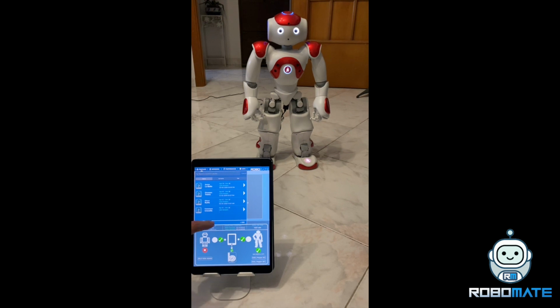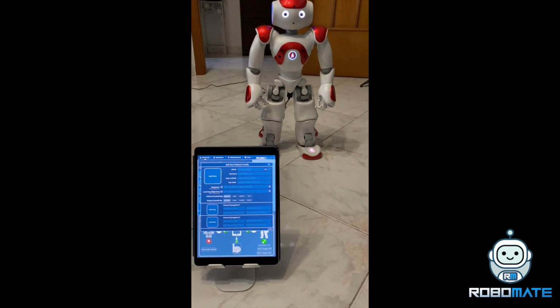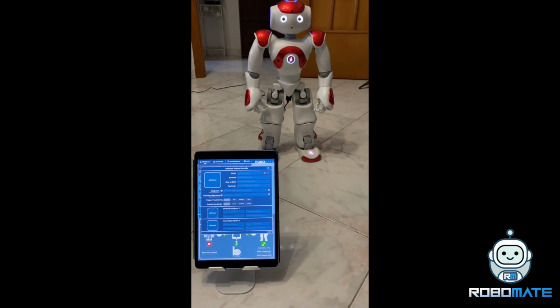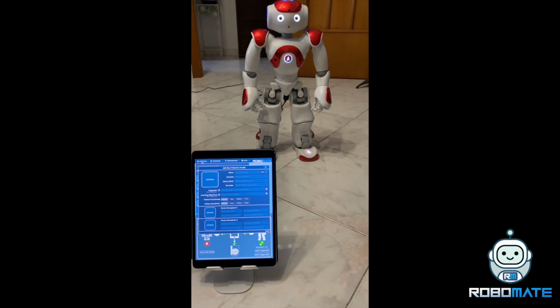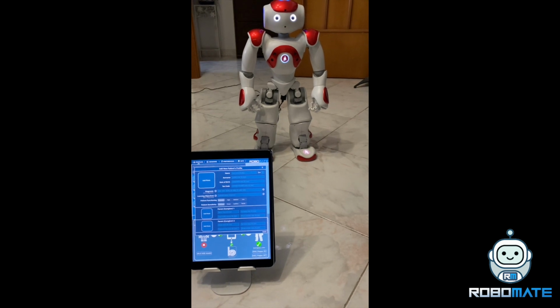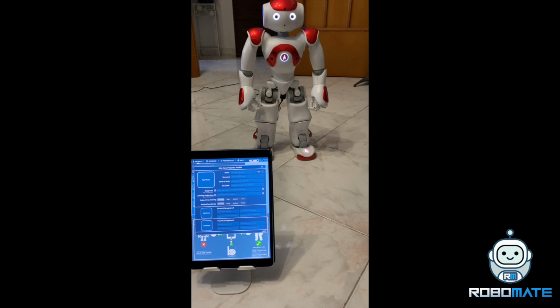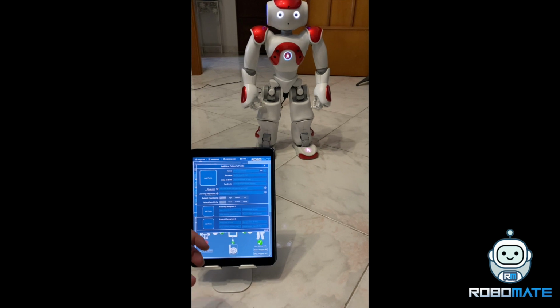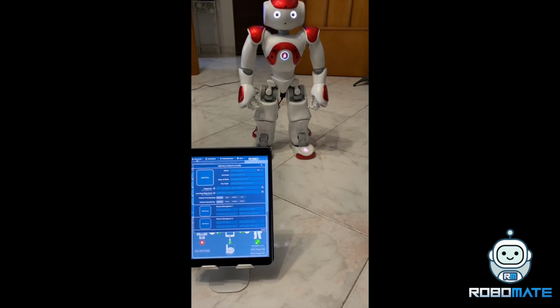First of all, you can create a patient profile, with all the data for the patient, including name, surname, date of birth, but also the diagnosis and learning objectives that the child could improve during the therapy using the robots, and also the functioning and the sensitivity of the patients. For example, if the patient is high, medium, or low functioning, or has a sensitivity in the visual, auditive, or tactile area.